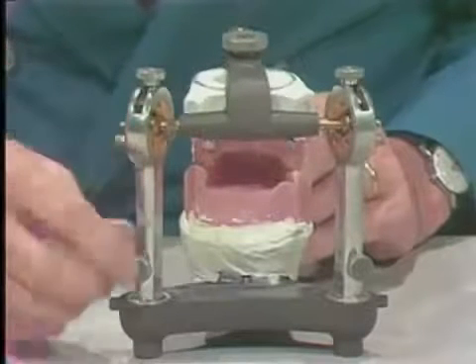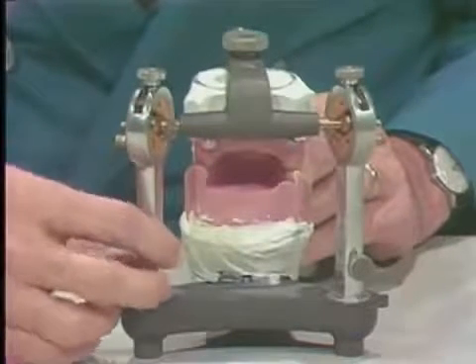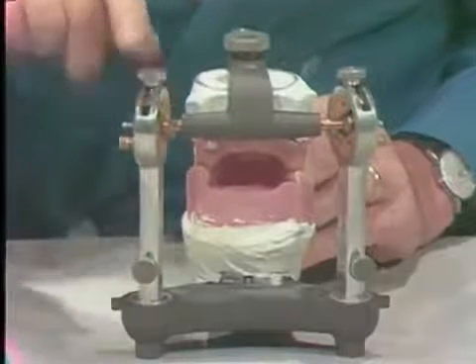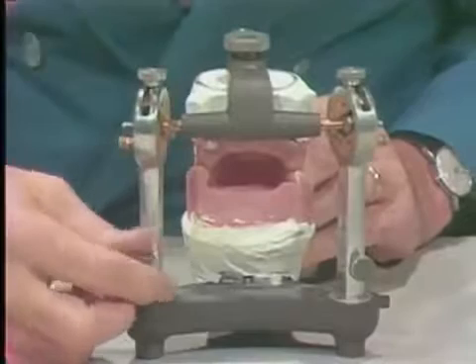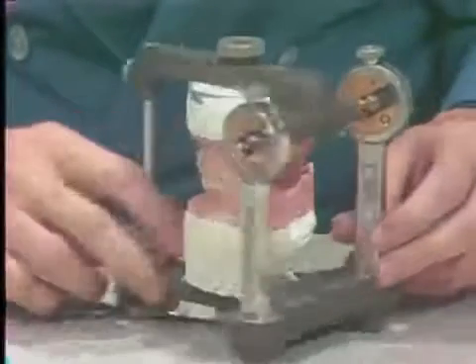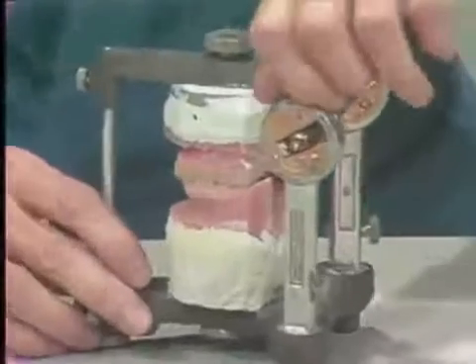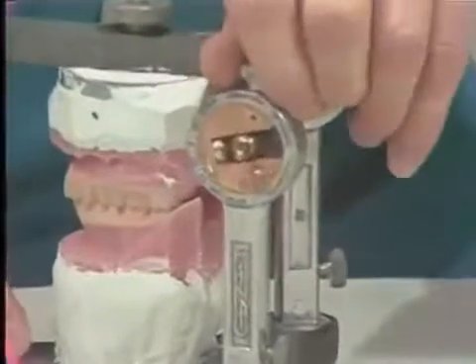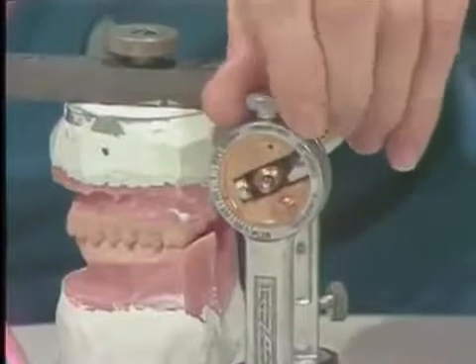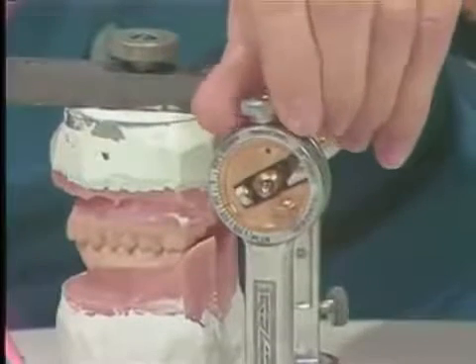So the amount of movement and the path of movement is affected by the setting, but since this is an averaging articulator, it'd be in a straight line rather than in a curved line. Now the condylar movement, as I mentioned before, is relative to the angle of eminentia, and this is somewhat related to the anterior slope of the glenoid fossa.